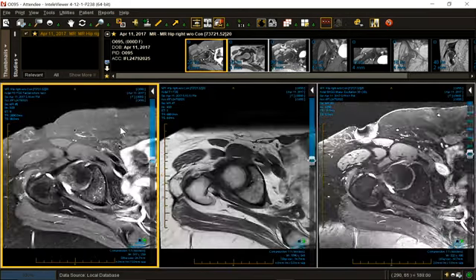Very attritional ligamentum teres. The space is fairly broad, and there's a little fatty hypertrophy, which happens with insufficiency of the ligamentum teres. I'm not sure I have the resolution to say it's ruptured, but I'm confident that it is abnormal.